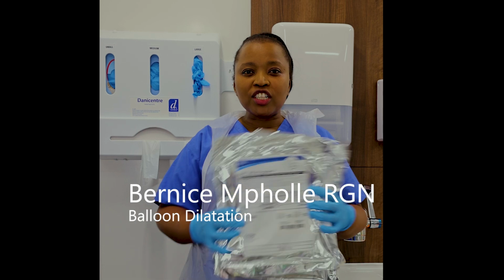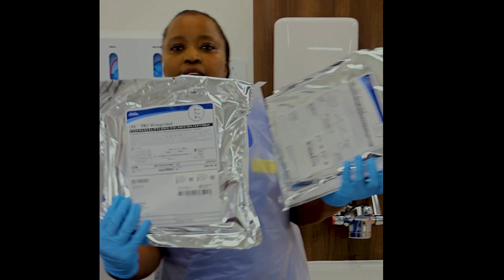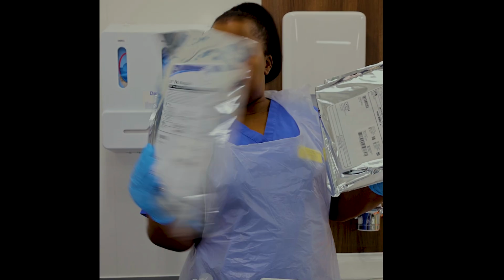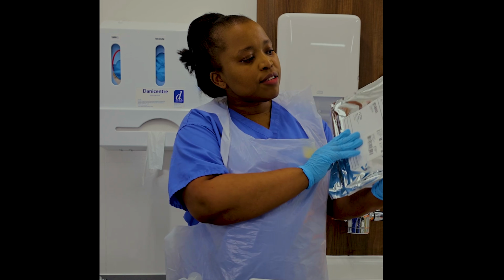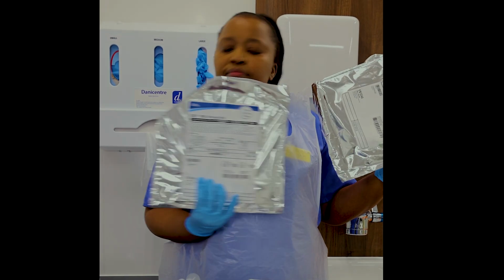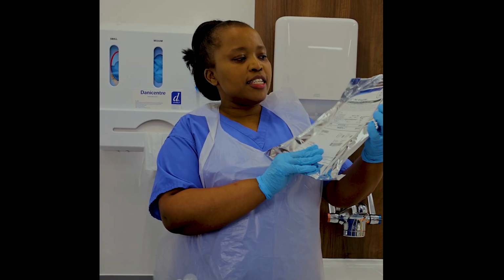Yes, so we have all these different types of balloons. These balloons are from sizes 6 mm to 8. There is another size which is 10 to 12. There is another one which is 12 to 15. There is another size which is 15 to 18. There is another one 18 to 20. So you need to bring all these various sizes, because the endoscopist will decide which size they will want to use, depending on how the stricture will be like. It can be esophageal stricture, it can be colonic stricture.